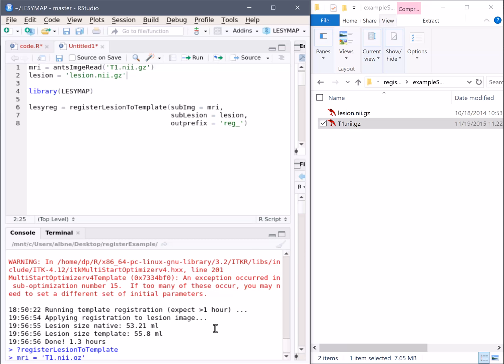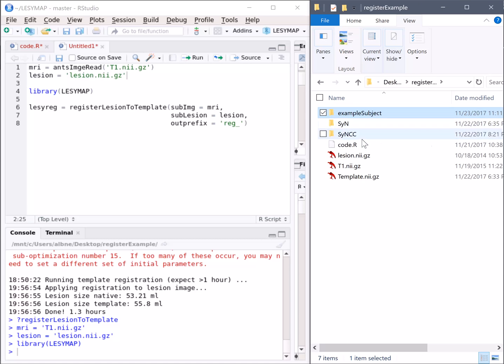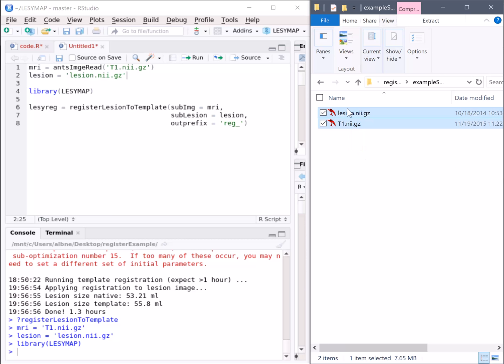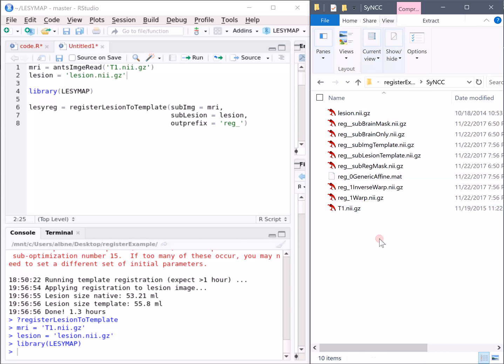Okay, so you have performed all this registration and now you want to see the results. And I told you that if you specify the output here, you should see a bunch of files on the side. Let me show you that result, what you'd see. These are the files that are produced by the registration. Actually, let me just copy also these two files that should have been in the same folder. Okay, so this would be the folder after you run the registration.